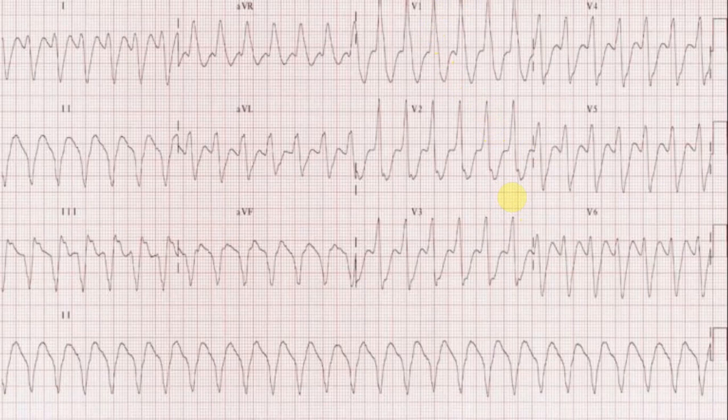Thank you. Excellent. So that's a really good interpretation in a very systematic way. So again, whenever we look at an ECG, you need to go through this step by step in a very systematic way so that you don't miss anything. And this is from the Brugada criteria. It looks like it is a ventricular tachycardia.